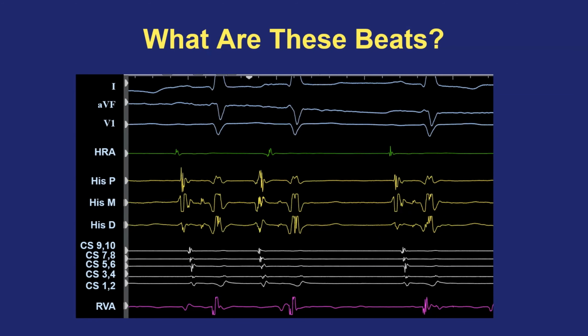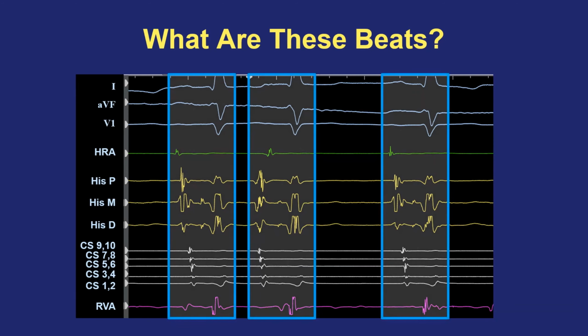Here are 3 beats on this page, and maybe hit pause and reflect for a moment if you can identify what is the nature of these 3 beats. Because there are 3 and 2 of them are close together, I'm going to start by showing you which signals belong to which beat. And the next thing I'll point you to is that beats 1 and 3 look very familiar.